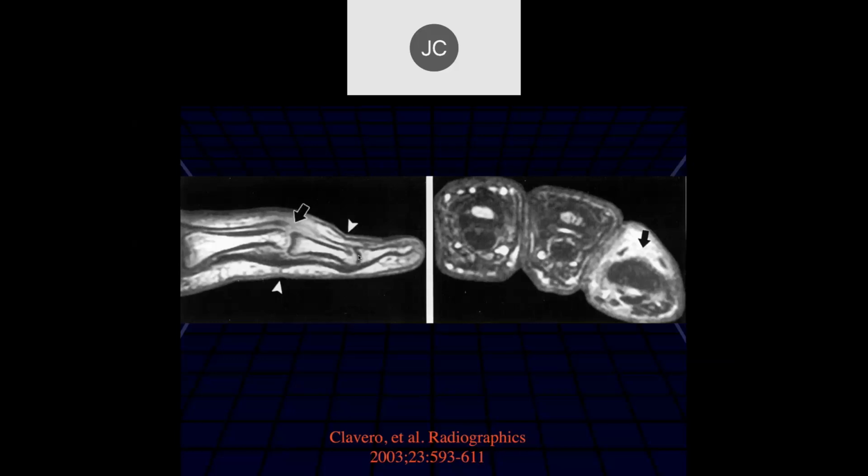And what's that called? This boutonniere deformity? That's the boutonniere deformity. So you can see the physical reasons why you get the boutonniere deformity. This is classic if you have injury to this due to rheumatoid arthritis, but you can also get this same deformity when you get a central slip tear, which can be due typically to penetrating trauma.